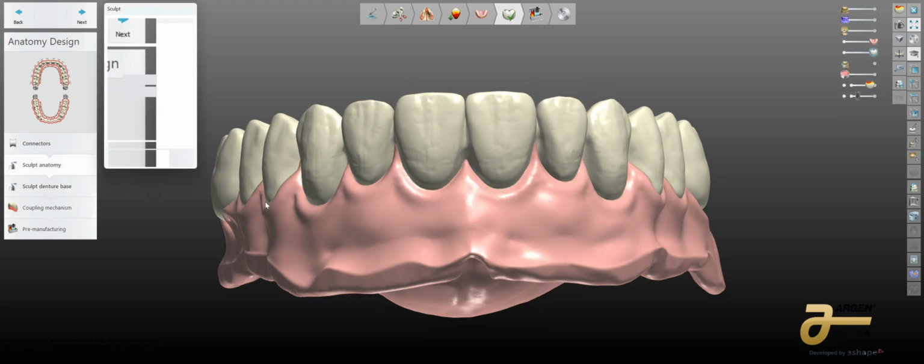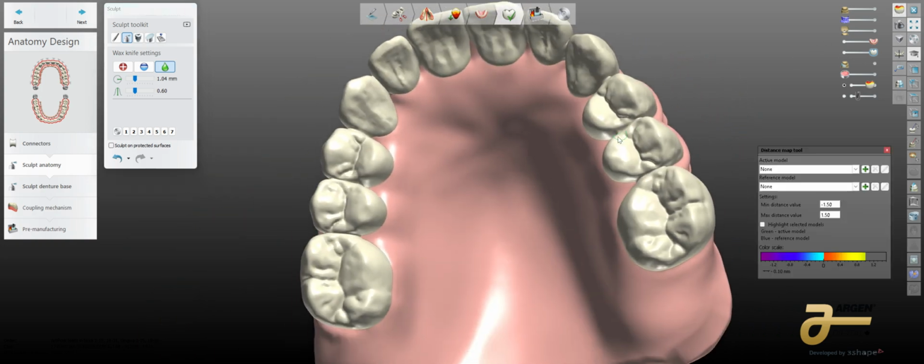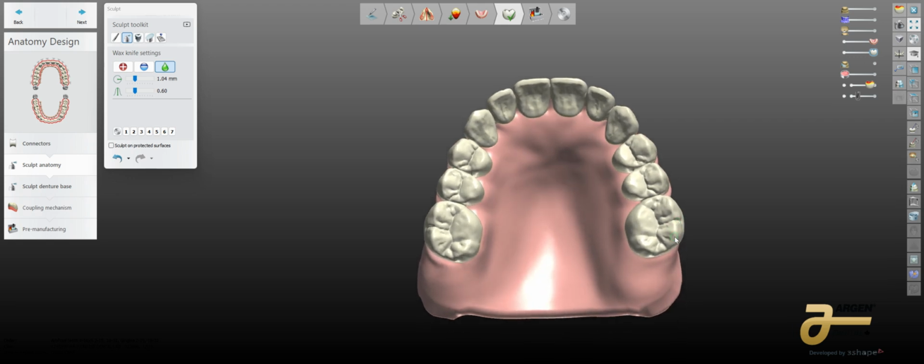But before, I kind of jumped one step here. You can use the heat map here to do some really cool things. I'm not going to show it all, but I know most of you guys will not have seen this because this is in the beta. So that's just a little sneak preview. It has some cool features for us.